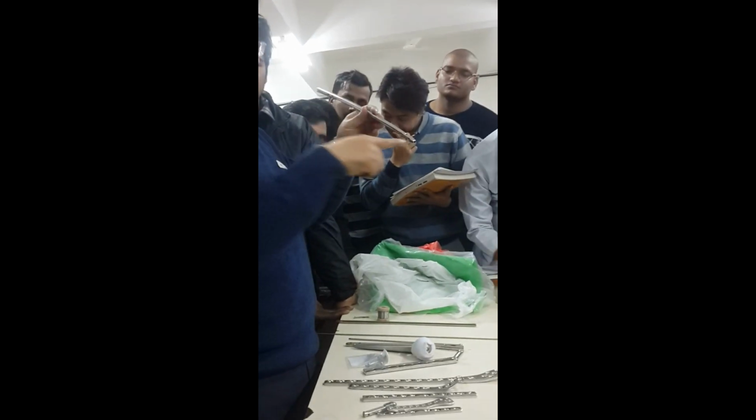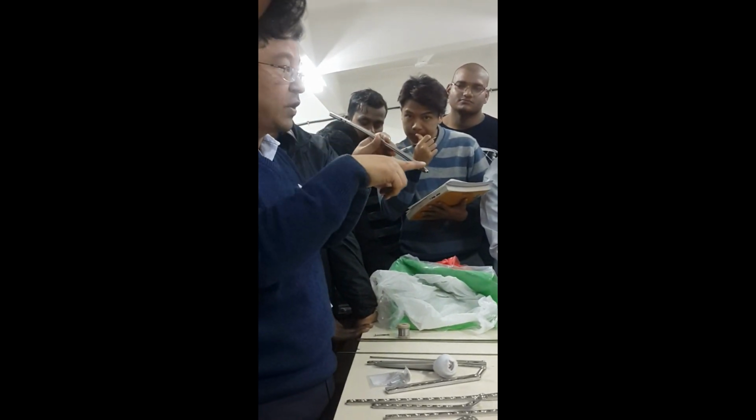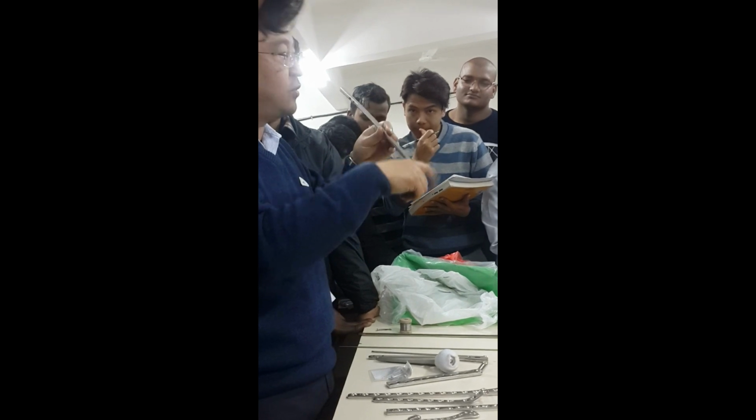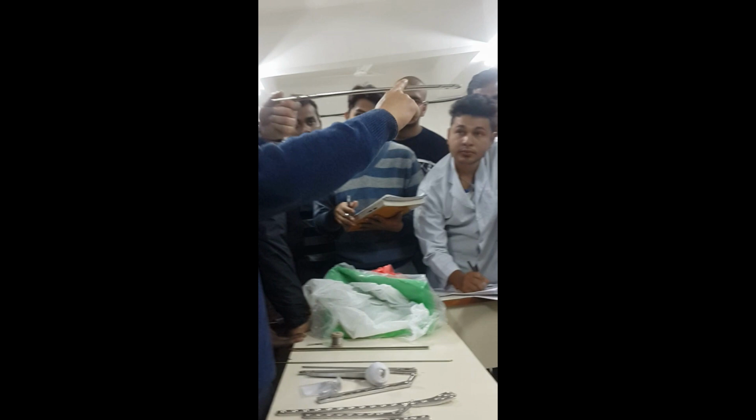The advantage is that it provides rotational stability, since it is interlocking, with a locking bolt. The locking bolt is not meant to give compression. You just put it like this so that it does not rotate. So remember the curve: there is an anterior curve.